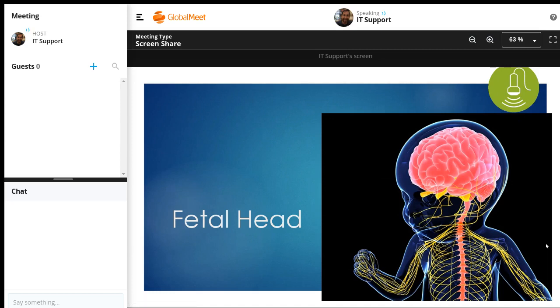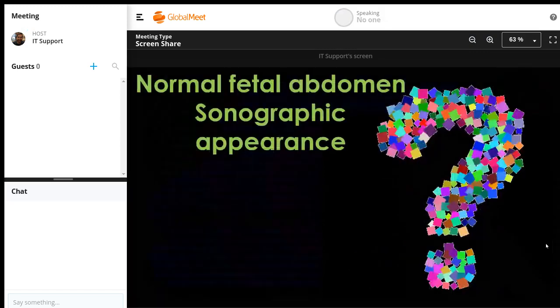Welcome to week 10. Today we're going to be talking about the fetal head. Hopefully you've already done the online portion of the normal fetal head. We're going to start off like we have been with everything else, with some normal anatomy, and then we'll go over them. I'll give you some time with each slide so you have a minute to write your answers down. So we'll do those first. So we'll start.